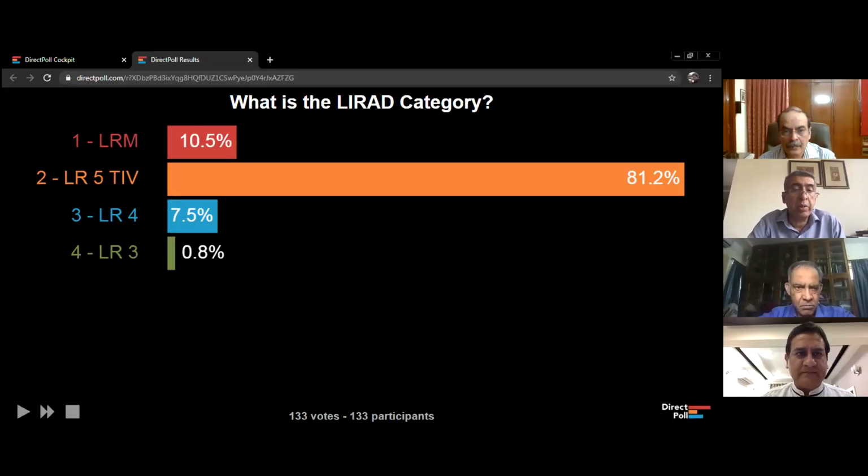The answers would be coming in. These are the answers which have been given by people. So very good. I think most of you have got it right. This is indeed an LR5 TIV lesion.